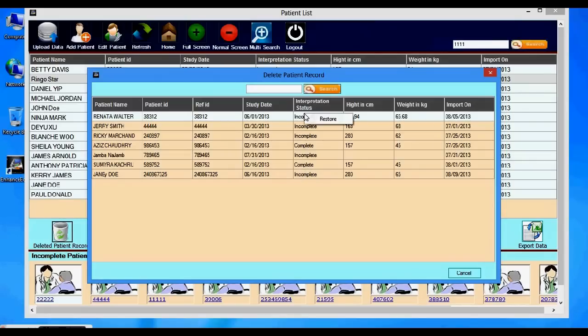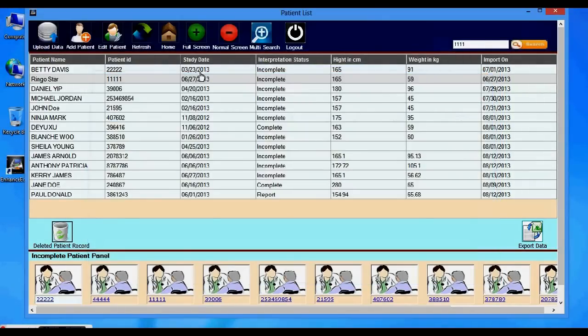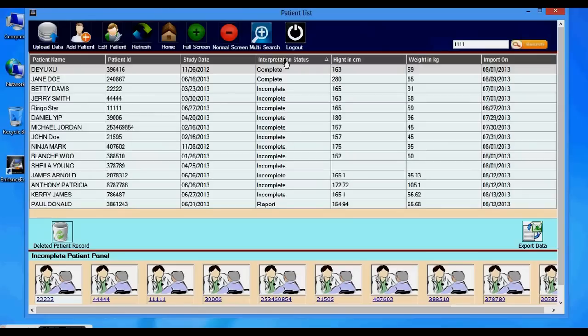Please note, you still have the option to restore the file back to the original patient list. To do this, right-click on the patient file and select Restore. Click Cancel and close out. Go to the Menu Screen tab at the top and click Refresh. Reopen the patient file.